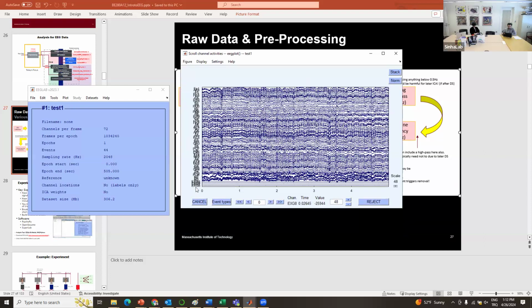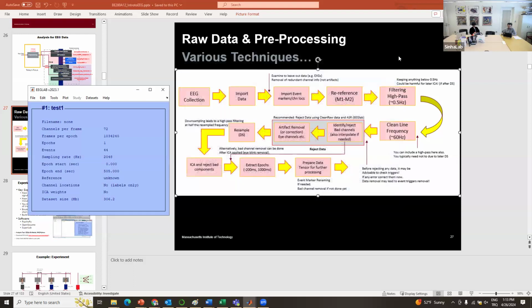One thing that you realize is that we have extra EXG channels here, or MISC channels, EXG 5, 6, 7, 8. We need to remove them because they have no information in them, not even noise, because we haven't used those electrodes. And that can also happen to you. So we're going to remove them. And the removal is pretty easy.